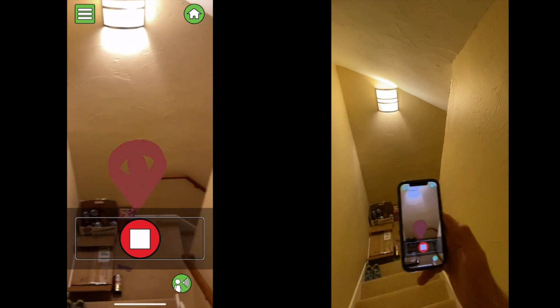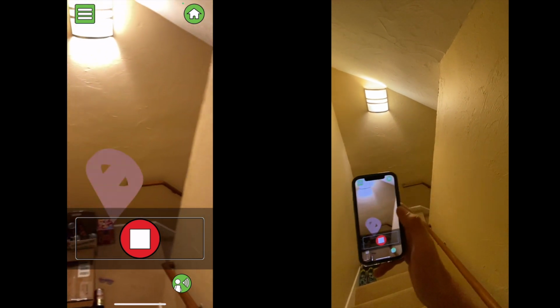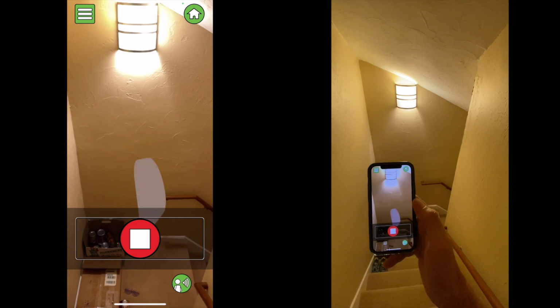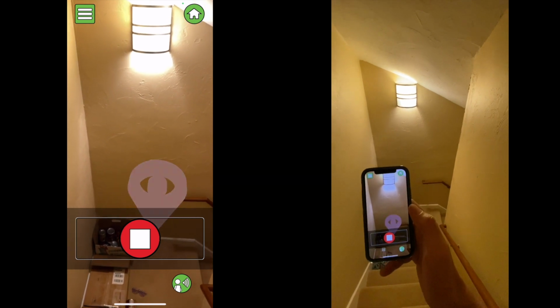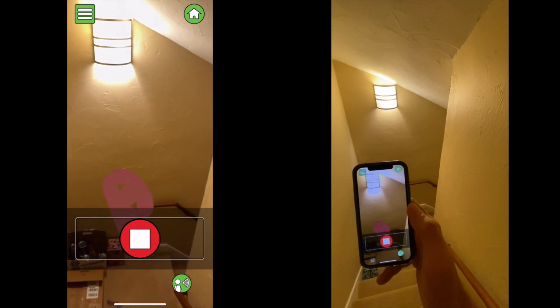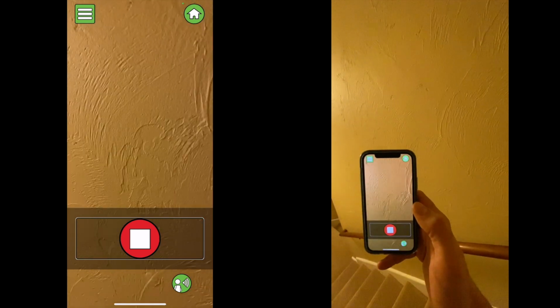And when the device is pointing towards the key point that we're supposed to be going to, we get an indicator from the phone, which is a little tapping sound that you're hearing. What you can't experience through the video is that I'm also getting a haptic feedback cue as well. So that's vibrating slightly every time I'm pointing in the right direction. When you're off course, it just doesn't say anything, but there is a get directions button.